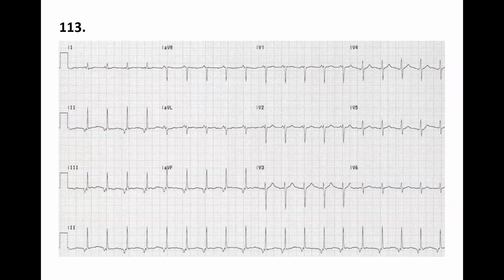Hello, Professor. When I looked at the ECG, it looked rhythmic. When I did the heart rate, it looks around 2.5 boxes, so it's around 120 BPM, which means there was tachycardia. When I looked at lead 2, I was a bit confused, but is this an inverted P wave? Yes. So I saw inverted P waves before the QRS.